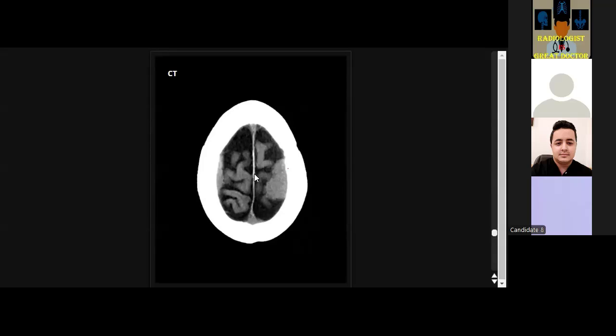Yes. Okay, don't help, my friends. Don't write the answers first. Okay, what other differential? So the main differential now is meningioma in younger ages, in younger patients.